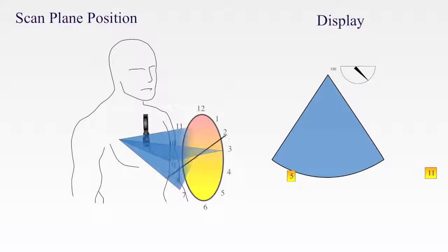This image demonstrates the rotation of the omniplane angle from 0 to 120 degrees. You can see that systematically using this set of 5 angles will result in coverage of the entire clock face, and thus of the heart that it represents.